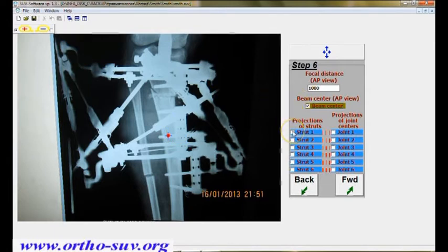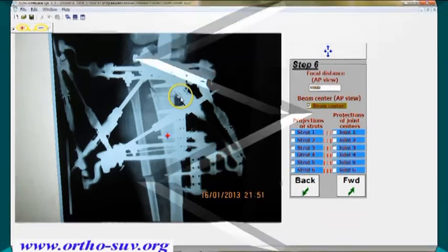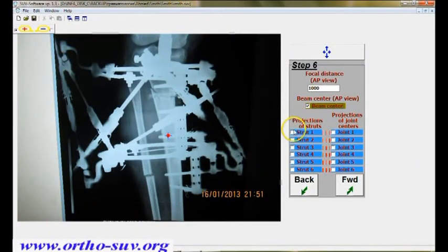If we have previously, while making X-rays, forgotten to mark the beam center on the cassette by a subject visible on the X-ray, in this case we have now to try to find the approximate center of the X-ray film and to mark this beam center in this point.